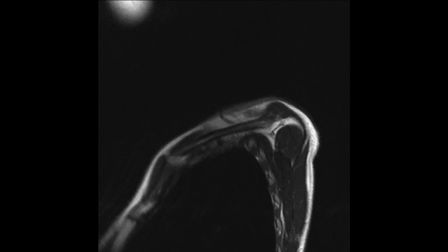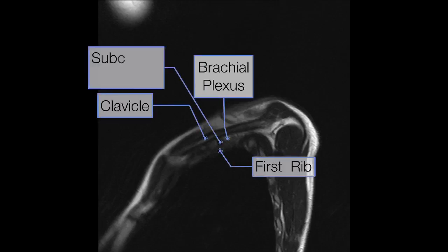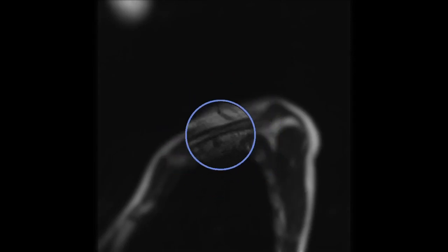The reason for these findings is not a cervical rib, but in fact, with the patient's arms elevated, we can see how the left clavicle approaches quite close to the left first rib, causing severe narrowing of the left costoclavicular interval. There's compression of the left brachial plexus with severe effacement of perineural fat, and there's a narrowed lumen of the left subclavian artery, which we already know from the MR angiogram images.